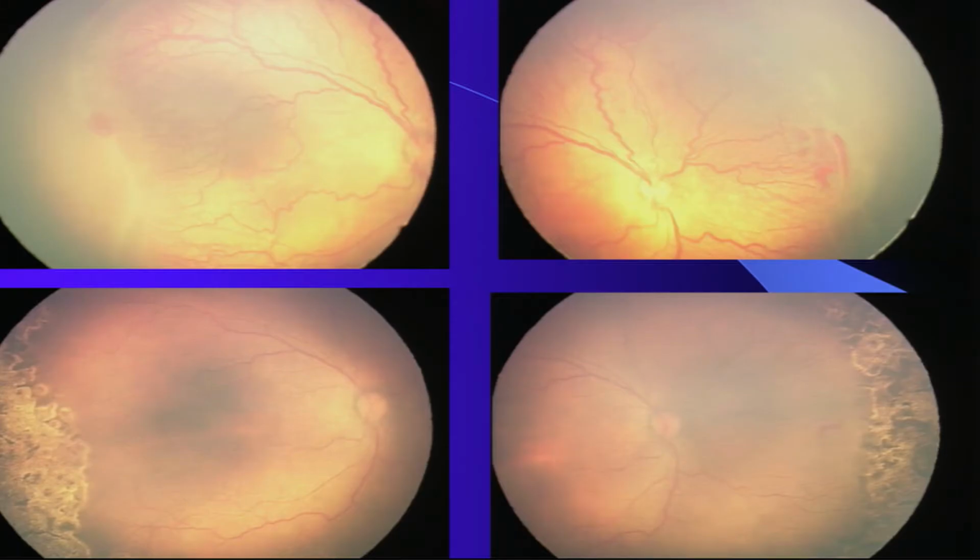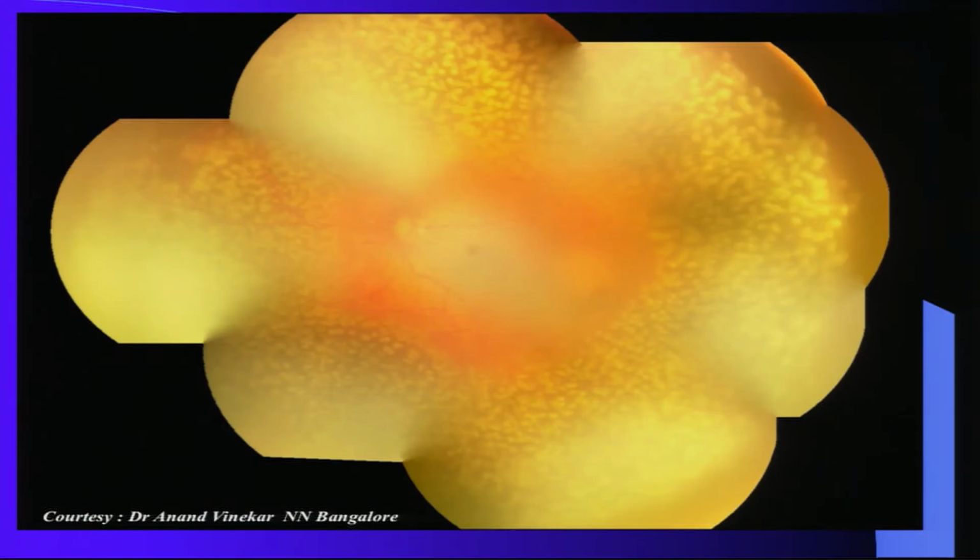And as far as the documentation is concerned, this is one of our own cases. You see, once you have diagnosed a treatable case, look at it in 2 weeks' time: these vessel calibers become normal. How beautifully the disease will regress if you do a proper treatment. So that is what you can even show to the patient. You should show it to the parents as well as to your students, and that is where they get convinced how effective the treatment is.